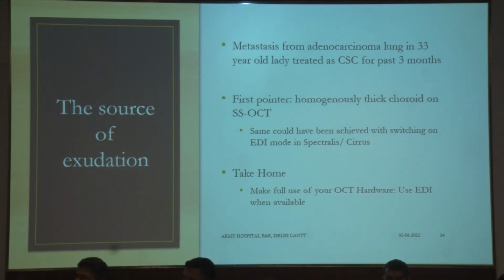When the lady went for a PET scan, we started thinking in terms of metastasis, and yes, it was a case of a metastasis. So wherever possible, even with your Cirrus OCT machine, please use EDI mode. These can sometimes help you clinch a diagnosis, or make you think of something which you normally tend to miss out. Please use your OCT hardware EDI mode whenever available. And the role of OCT angio cannot be overemphasized because it's non-invasive. With this, you can diagnose so many things which otherwise mimic PCV. Thank you.